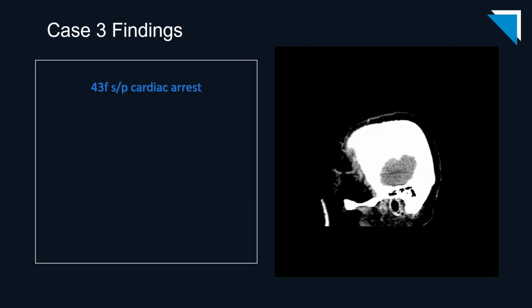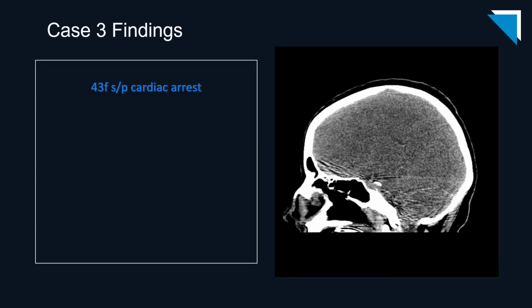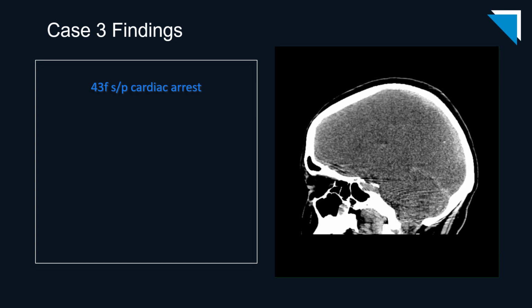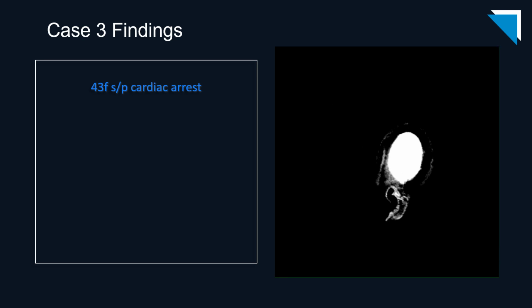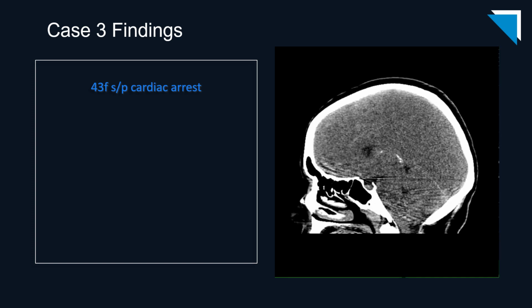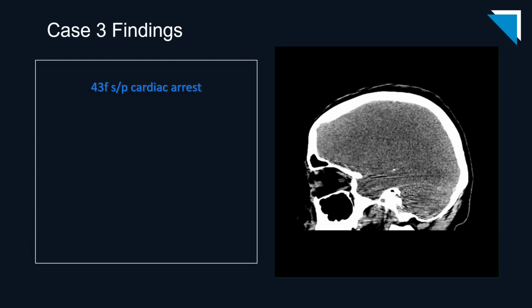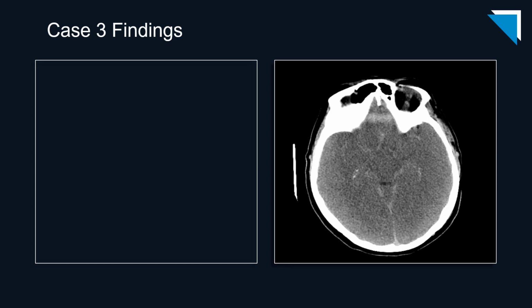The sagittal images from the same patient. I'm sure I'm going to sound like a broken record here for the next few minutes, but that's by design. In this case, again, we have the diffuse loss of gray-white differentiation with associated sulcal effacement.